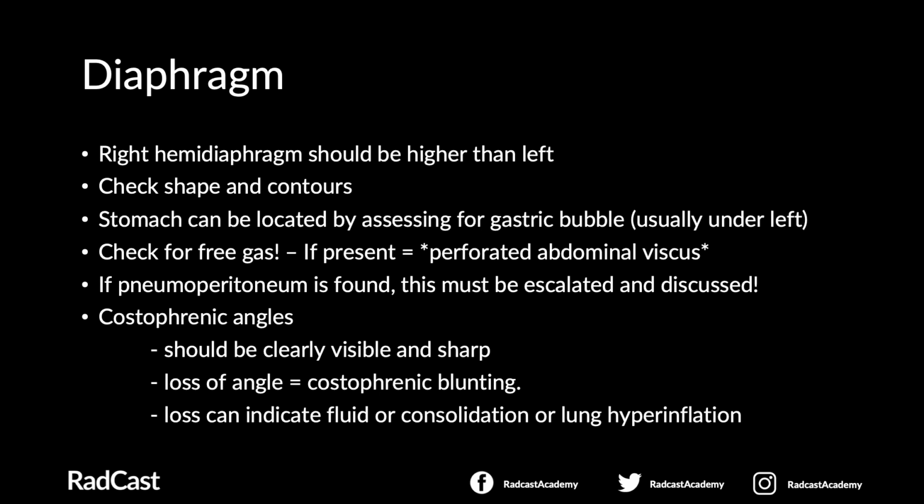Finally, look at the costophrenic angles. They should be clearly visible and sharp, well defined. If you have a loss of a costophrenic angle, this is a result of costophrenic blunting and can indicate fluid or consolidation or even lung hyperinflation.